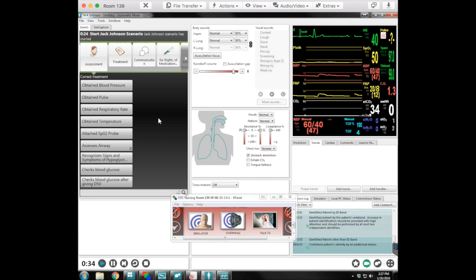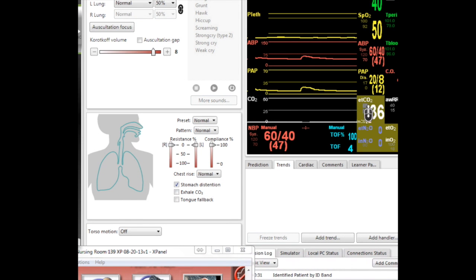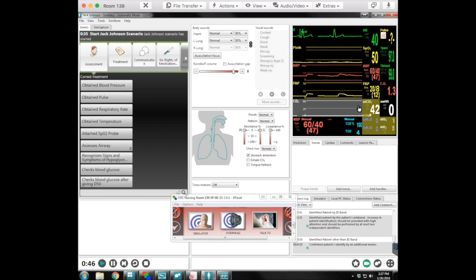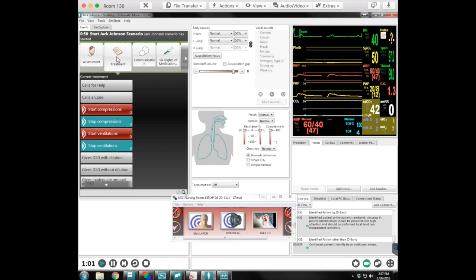We're just going through. And you can see over here on the right part of the screen that our patient is not doing well. He's got a 0 respiratory rate right now, and a heart rate of 40. So not doing well. Hopefully your students at this point have moved to the AMBU bag and are doing some corrective action. So you're following along in their actions by jumping between these tabs and seeing whether or not they've done what they're supposed to be doing.